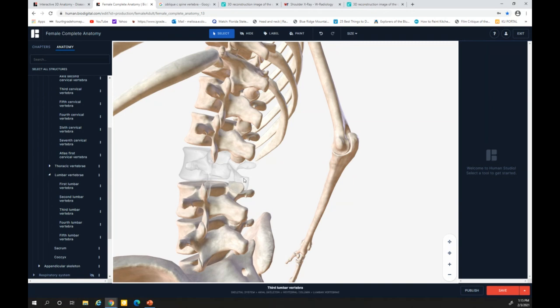We've got the spinous process here, superimposed with the inferior articular process on the other side. We've got the transverse process sticking out here. None of this is of interest right now as we're looking at this image. So RAO, looking at the left side of that vertebra. Left ilium is elongated. Left rib is elongated.